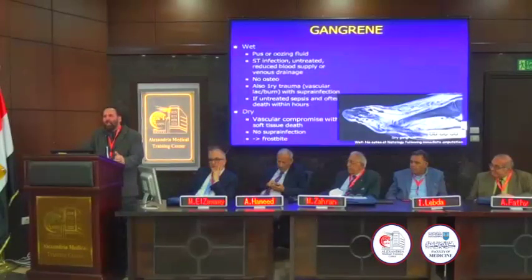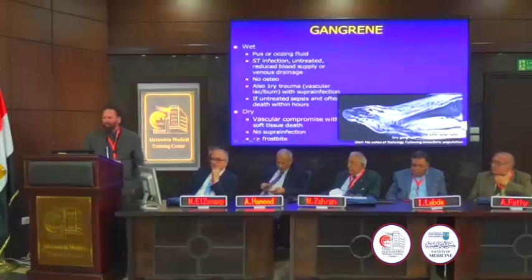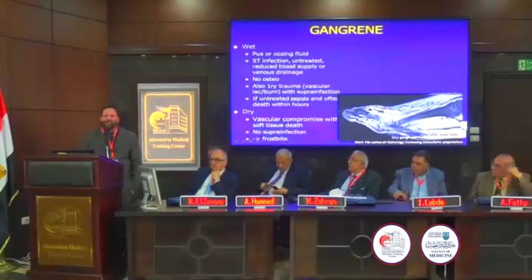Wet and dry gangrene, if you see changes in bone, they look weird, and don't mistake them for osteo, because neither of them have an association with osteo. So this was a case my resident saw on call when I was in New York and called this osteomyelitis.